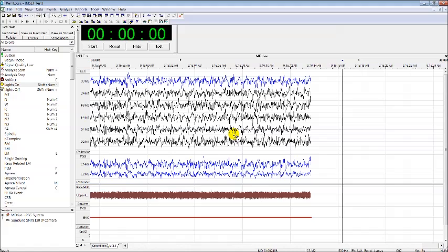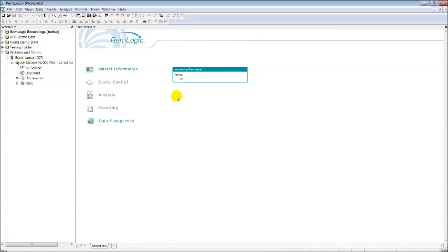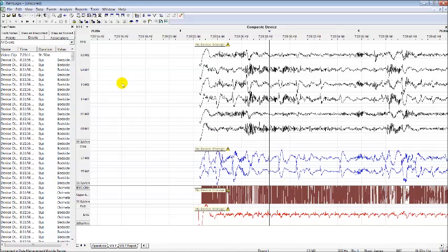Next up, I'm going to show you another example of how some sleep labs use RemLogic to score an MSLT study. Now I will show you the second method. Let's say that during the recording they did not score on the go. They just put the lights off and lights on for each nap, and put tag notes to denote nap 1, nap 2, nap 3, nap 4 or nap 5, and they visually count the time. When they see a sleep stage, they record an additional 15 minutes from the sleep onset. So I will show you here how we can score the data using RemLogic.